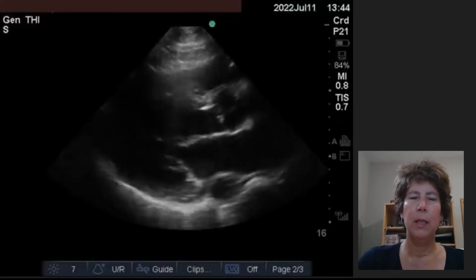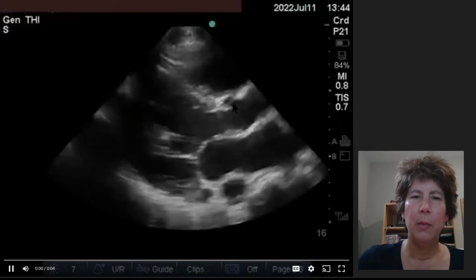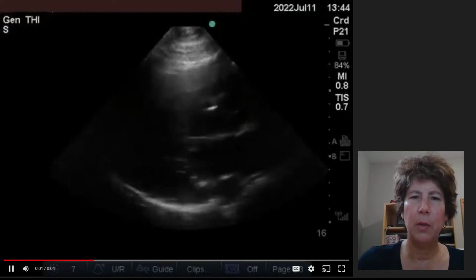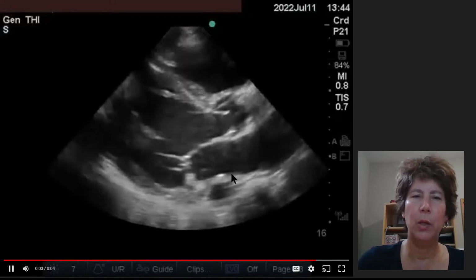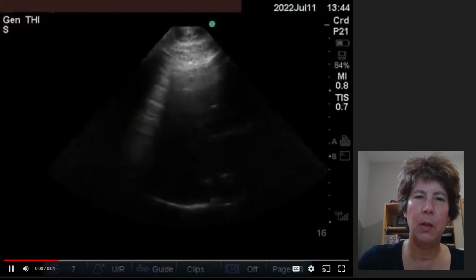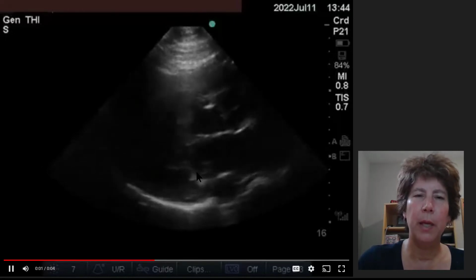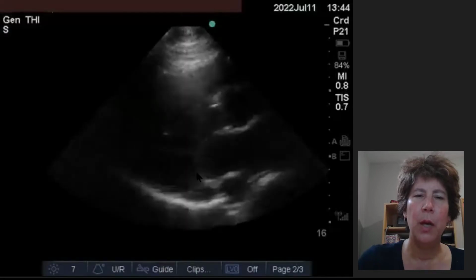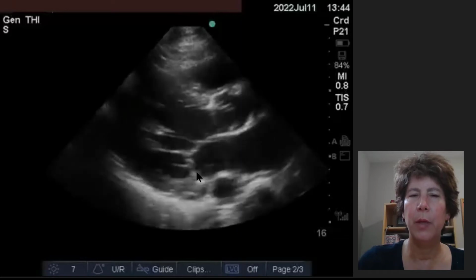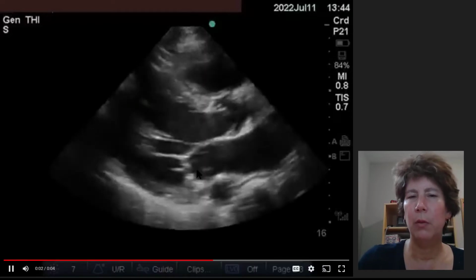So if we're going to look at this systematically, what can we say? The left atrial and aortic diameters in this view should be very similar. The left atrium probably seems a little bit enlarged here. The other thing that really jumps out at me in this view is how little this mitral valve is moving. If you see that in an image, you really want to manipulate the image or those loops, to make sure this is not just an image acquisition problem, that you're not cutting the valve at an odd angle. But if this is truly the mitral valve opening, there's something really wrong here.